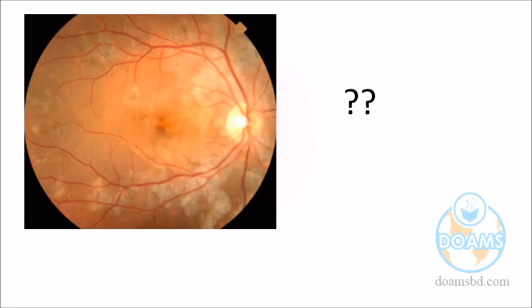Vessel numbers are normal. The macula is there in the center, but there are some scattered white areas as well as pigmentation. White areas and pigmentation. So Dr. Farial, which picture are you telling is angioid streak? Under the vessel, the white thing?